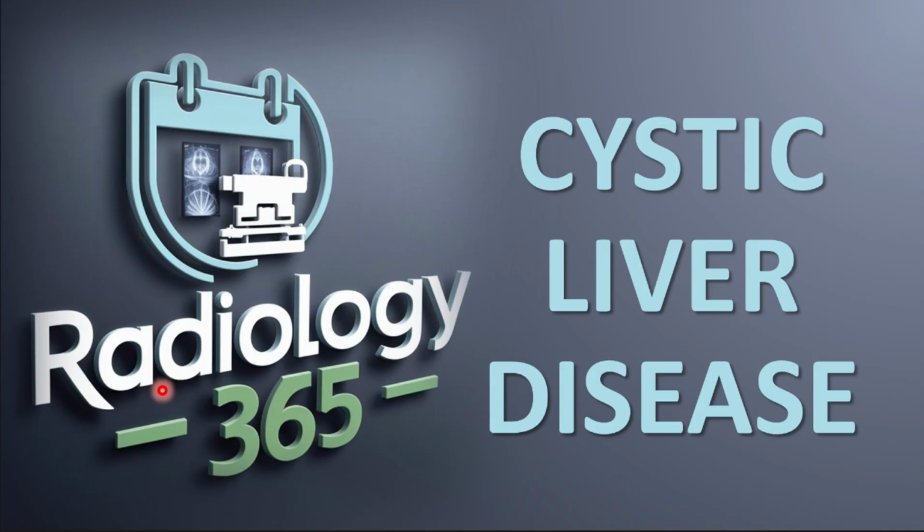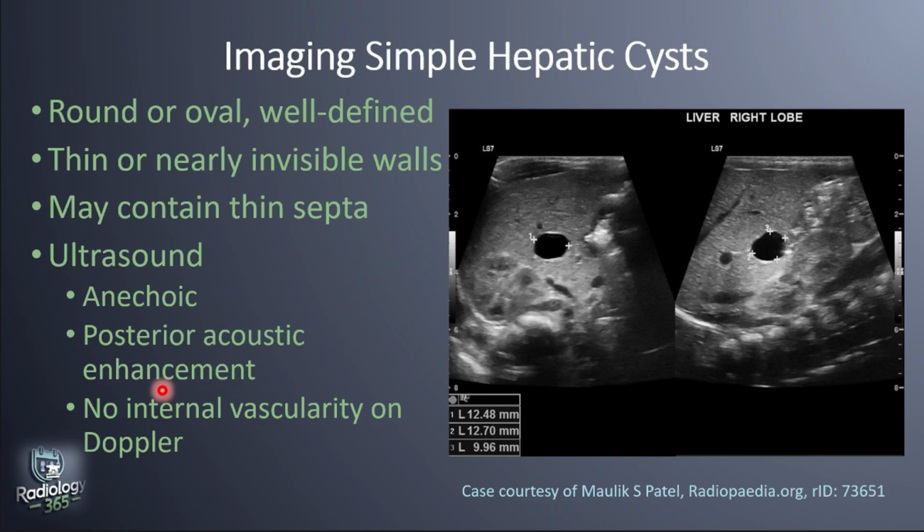Today we're going to be talking about cystic liver disease. Simple liver cysts have a pretty classic appearance across different imaging modalities. They are usually round or oval, sharply defined, and have walls so thin they are almost invisible. Occasionally, you might see a few delicate septations inside.